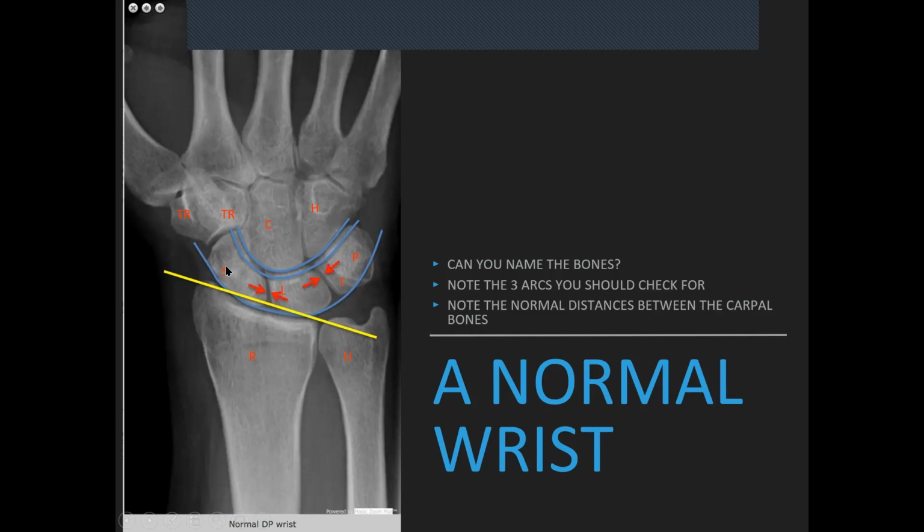All right. So you've got the scaphoid here, you've got the lunate, you've got the triquetral, and then you've got the pisiform. Essentially the three big ones, and then you've got a little pisiform bone that's over there. The trapezium, the trapezoid, the capitate, and the hamate. So it's just those few bones. That's it. I've done anatomy maybe 25 years ago, it still sits in my head, and I would expect you guys to also know how to do that. And then you've got your radius and your ulna.